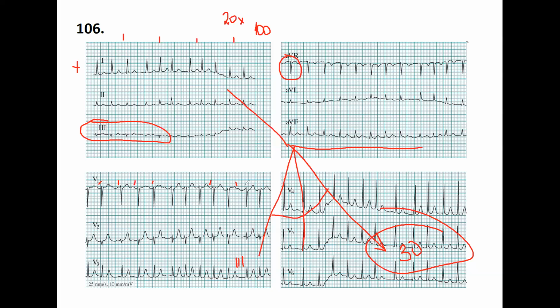But it's an atrial tachycardia or paroxysmal atrial tachycardia because you do have different P waves. It's not retrograde. If you had an AV nodal tachycardia, you would see some retrograde P waves, and that should be rhythmic, but this is arrhythmic. We will learn it in the next seminar.